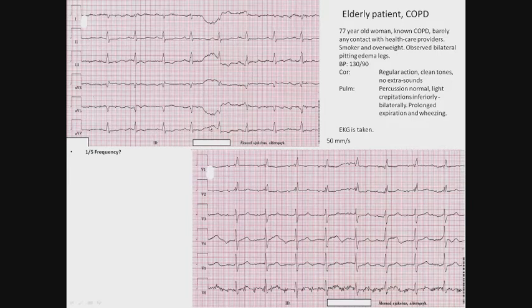Alright, let's see. Another one on a thick line is usually helpful. Let's see around here, 300, 150, 100, but it happened a little bit before, so a little bit more than 100, a little bit faster, maybe 110, more or less. So let's see. Right, 110, and it's also wise to just address if it's regular or not, and it looks regular.